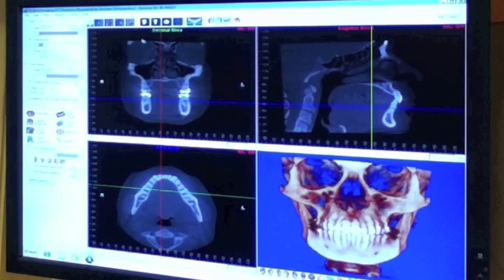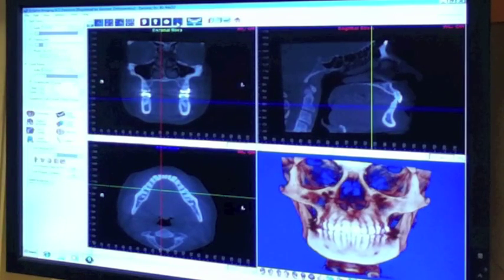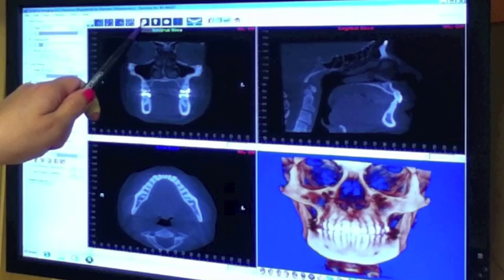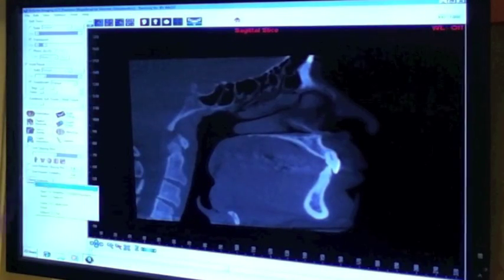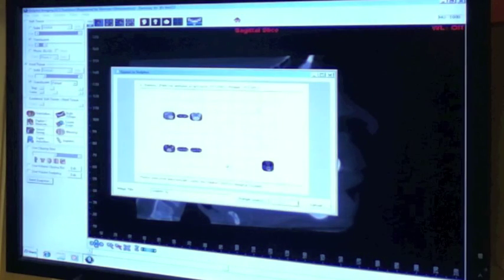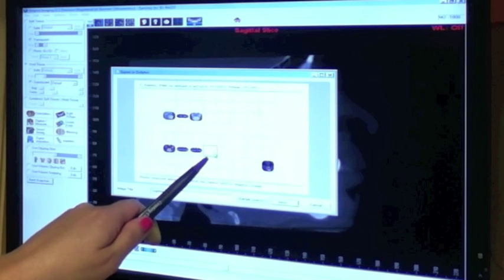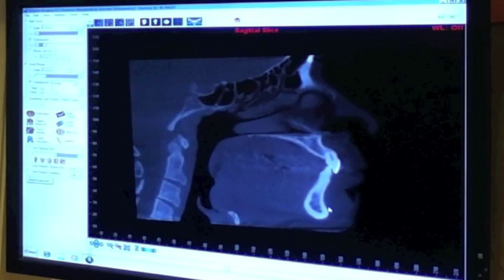Once you've got the images you'd like, click this Show Hide Crosshairs, and that will take the lines off of the images, and you'll save each one individually. So first click the little red sagittal slice view, and then Send Snapshot, Save to Dolphin Layout. You'll choose the 6th row down, and it will be next to the TMJ images, sagittal ones, and save.